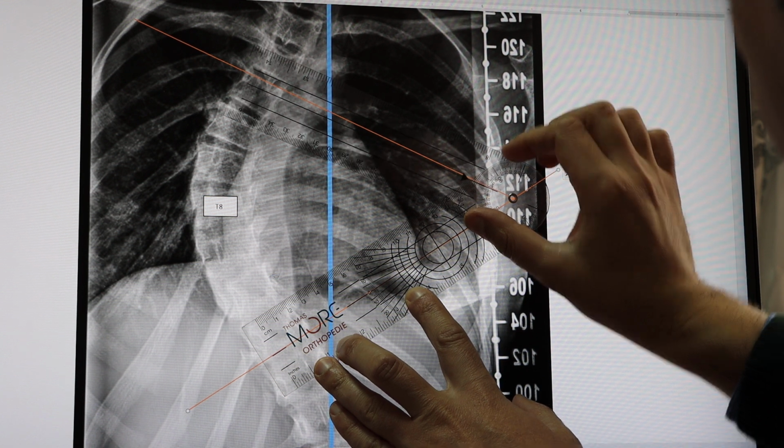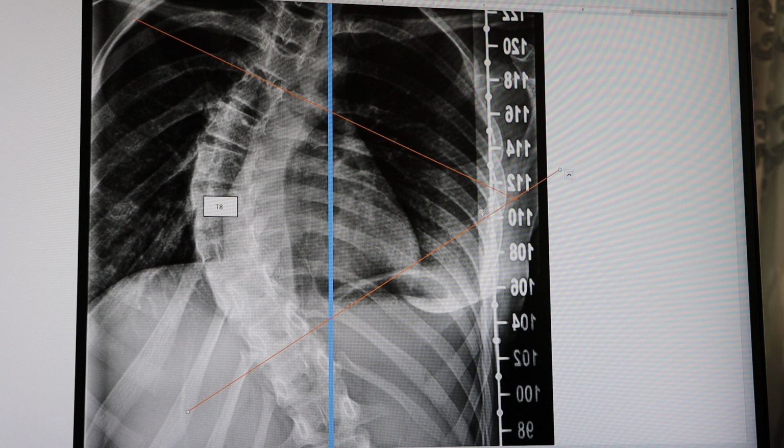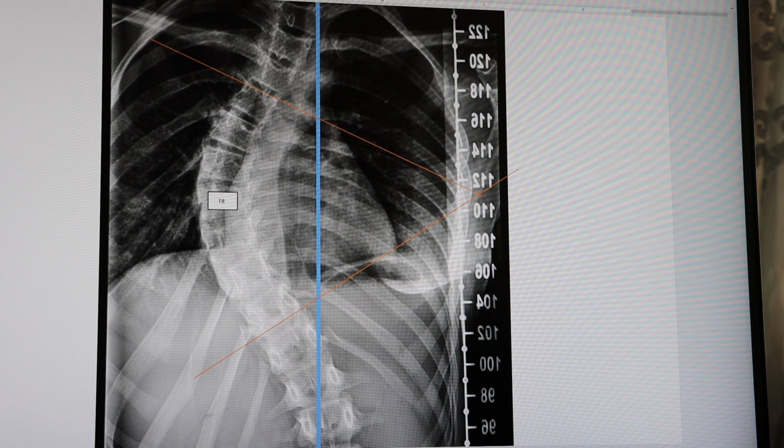And it is 55 degrees. So this is a massive degree, by the way. So it's a 55 degree Cobb angle. Now, let's add that to our identification of the curve. So we have a right thoracic curve, end vertebrae from, so this is 7, 6, 5, from T5 down to T11, with an apical vertebra of T8 measuring 55 degrees.